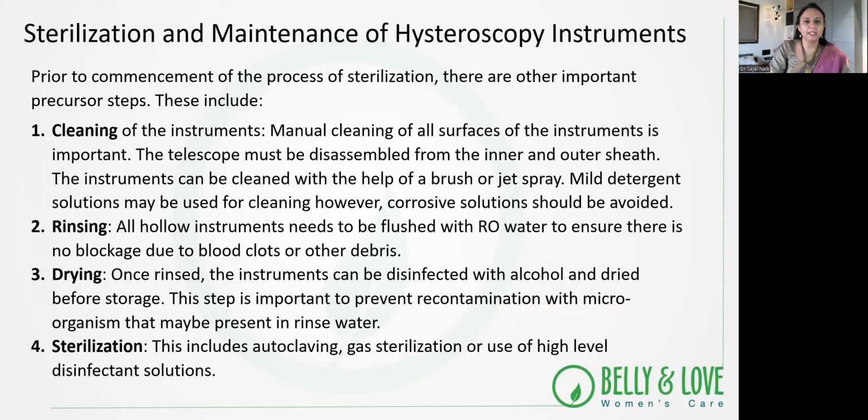They are very delicate. So there are precursor steps before sterilization and maintaining the hysteroscopy instruments. One is the cleaning. So manual cleaning is most important. You can use the brush or the jet water and spray, and then you can remove all debris and the clots in the system.